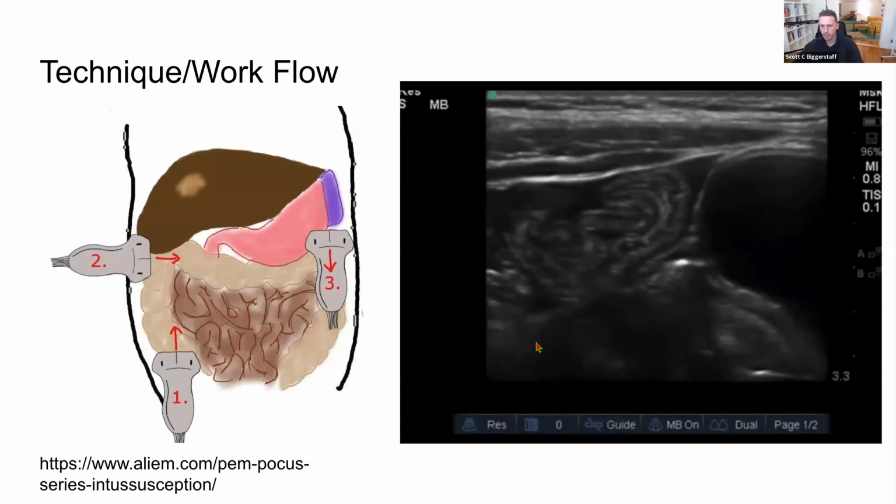So that's too many. If you're measuring in short axis, oftentimes what I saw in the literature is that a cutoff of 2 centimeters generally is what's used to separate large bowel from small bowel. So if it's less than 2 centimeters, outer wall to outer wall of that donut sign, that typically implicates small bowel. If it's greater than that, then that's more likely large bowel or ileocecal.